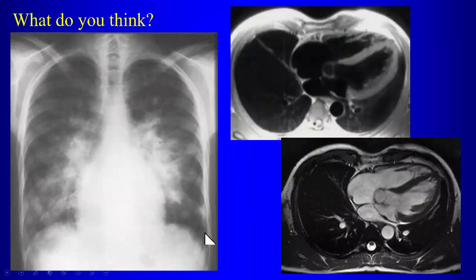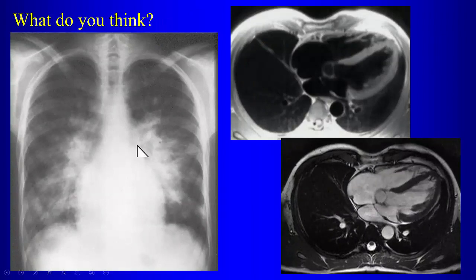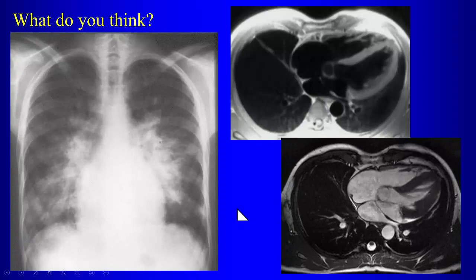All right, so here's another case. The heart's not really big in this example. We do have vascular congestion and failure. Then we have some MR images here. So what's the diagnosis in this case?